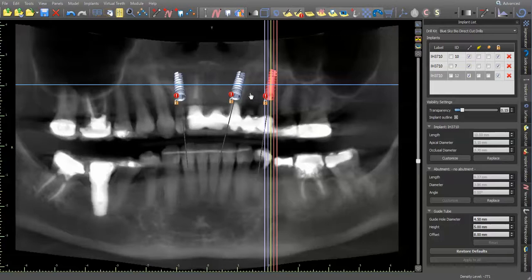We were originally going to put the implant in number 11 site. So we're going to originally do a 4-unit anterior bridge and a single tooth implant number 11. Tooth number 12 is questionable with the long-term prognosis. It's not going to cost her any more or any less just to remove it in 12 sites. So we're going to eventually restore this with a 4-unit anterior bridge and then connect it to this tooth number 12 implant.